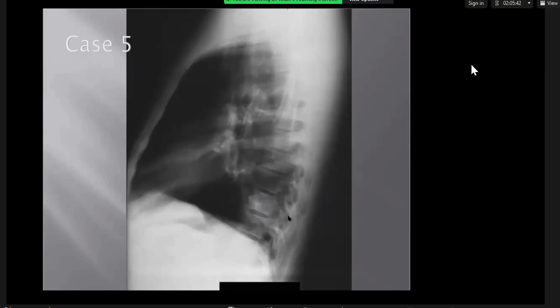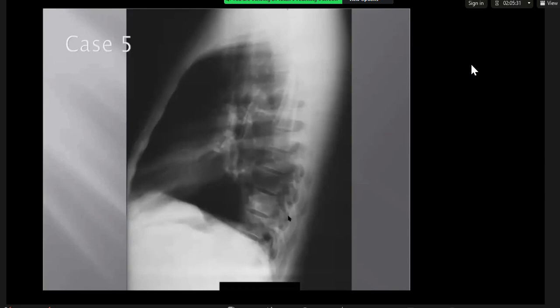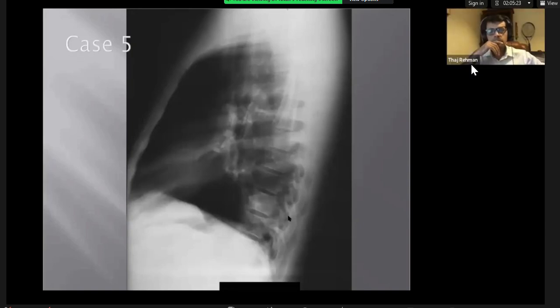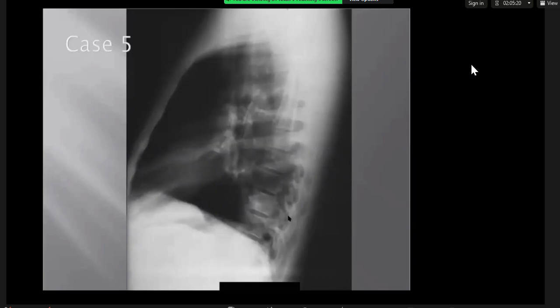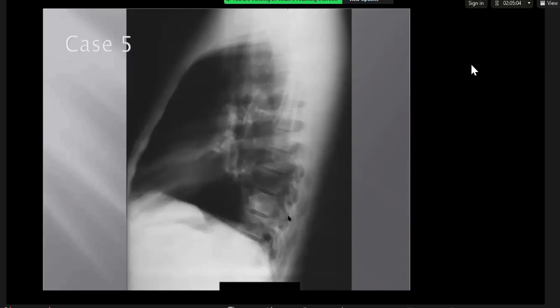Yep. So projected over the lower thoracic vertebral bodies, there's an increased density relative to those above it. Fantastic, yeah. As you said, you'd expect it to be more lucent than that. I think you can probably also see that there's some increased density. So one more question for you. There is something abnormal going on there. Is it in the spine or is it in the lung? I think it's in the lung. It looks like it's extending beyond the vertebral bodies.